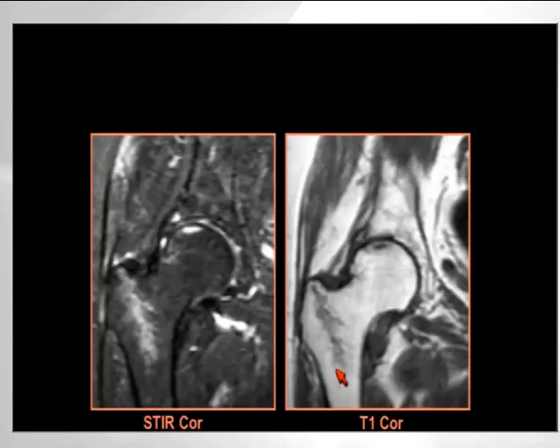The concept of incomplete fracture has emerged from MRI, actually. I was told by my pelvic surgeon that when we were first diagnosing these fractures, they didn't know what to do because it wasn't reported in the orthopedic literature. We were seeing these fractures. So the current recommendation is if you have extension to the medial cortex, they would fix it. If it's not extended, then they would just follow up, or the patient is on protected weight bearing. These are called incomplete fractures, and you will see more and more in your practice. Anytime you see a greater trochanteric fracture, they would like to do MRI to see the complete extent of the fracture line.